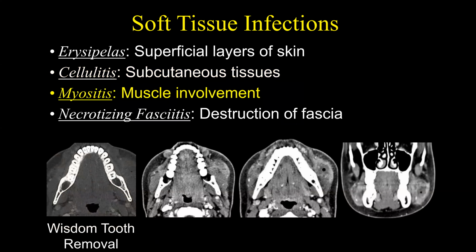And this was another patient that ended up coming through the emergency room. And this patient recently had a wisdom tooth removal. So this patient had bilateral wisdom teeth removed. And unfortunately, the patient was developing an infection and swelling of the jaw.